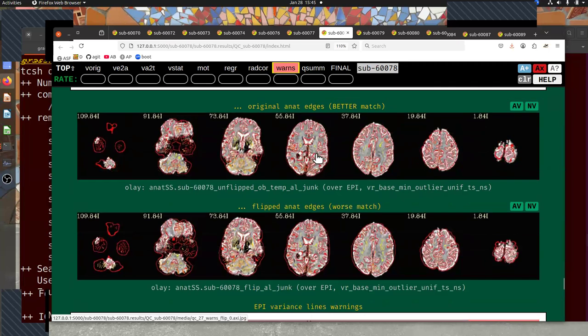All right. So this is a nice lesson, I think, about a couple of things here. The power of using the QCHTML to browse across a subject, a set of subjects, and to be able to check into individual ones for different properties as well.